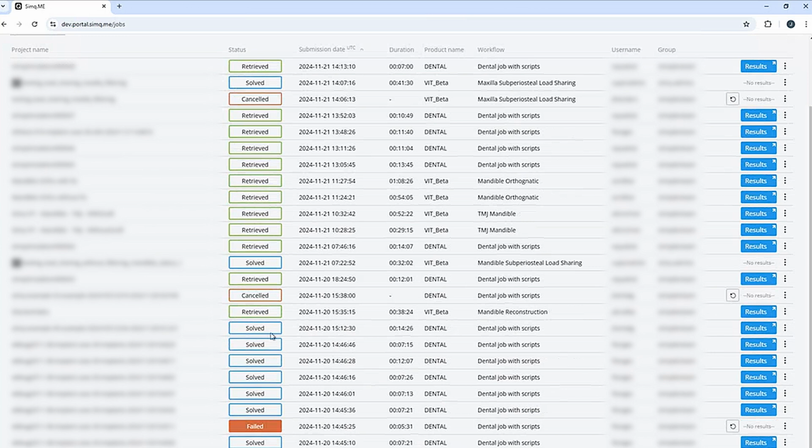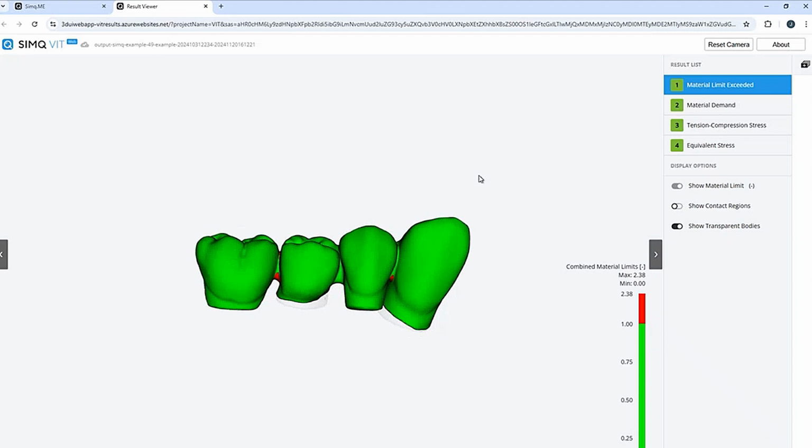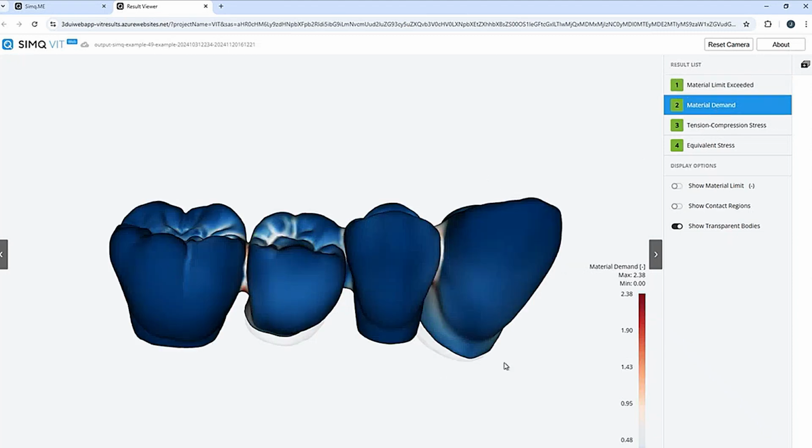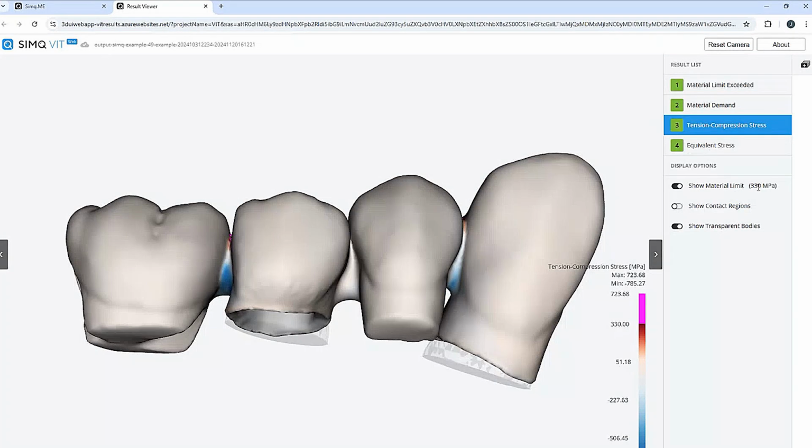After analyzing your model, you can check the results in your account. It is also important to receive feedback from users and make improvements. This allows us to meet customer requirements and optimize your project for 3D printing and processing.